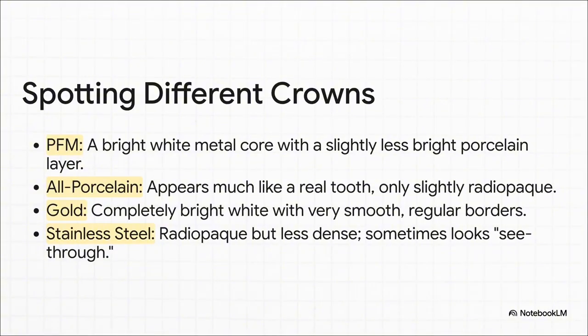And finally, stainless steel. You see these a lot on kids' teeth. It's bright for sure, but sometimes it has this kinda see-through quality to it.